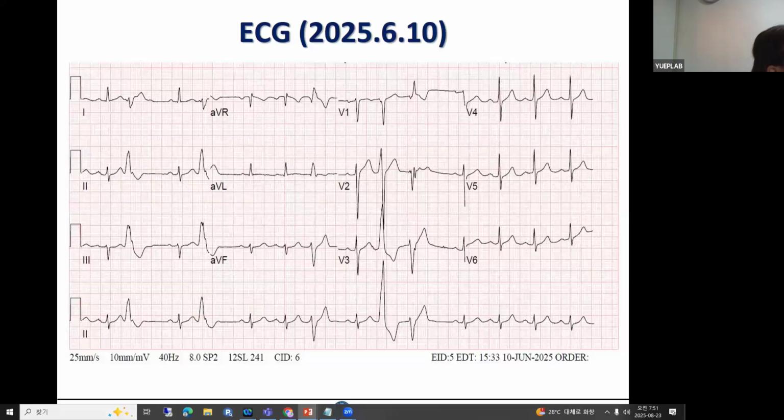So it's always valuable to think that this may be a single focus in the septum exiting bidirectionally. That's one possibility. The other is one focus with a long exit in the left side septum through the Purkinje fiber, because it conducts very fast. It looks that way, almost like a posterior septal fascicle PVC here, but it may not be, because it's a very narrow complex, almost fascicular PVC.